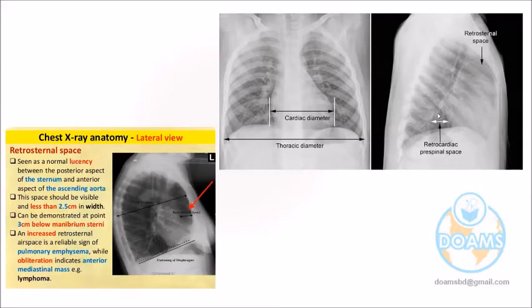The heart diameter should not be more than 50% of the chest diameter.